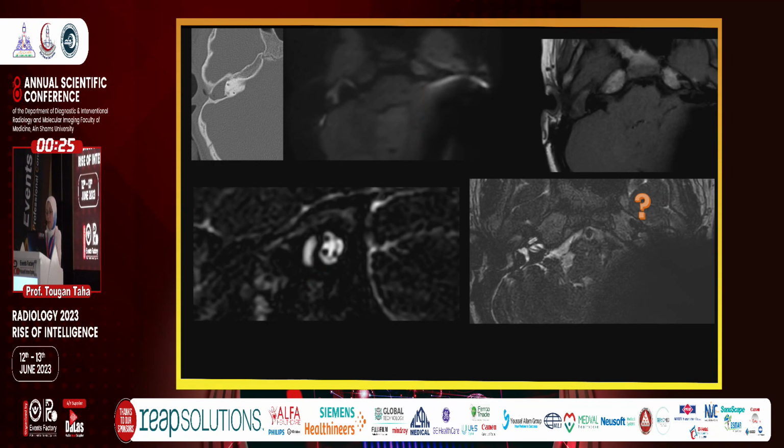Here is the CT and MRI of the patient, and here is the marked artifact around the implant, which is still within her ear. I cannot see the inner ear structure or the internal auditory canal, and this is the contralateral side, shows residual or recurrent cholesteatoma with diffusion restriction, and the good news is the normal right cochlear nerve.